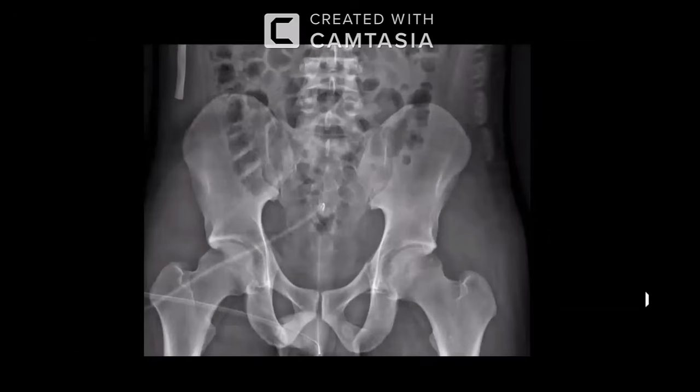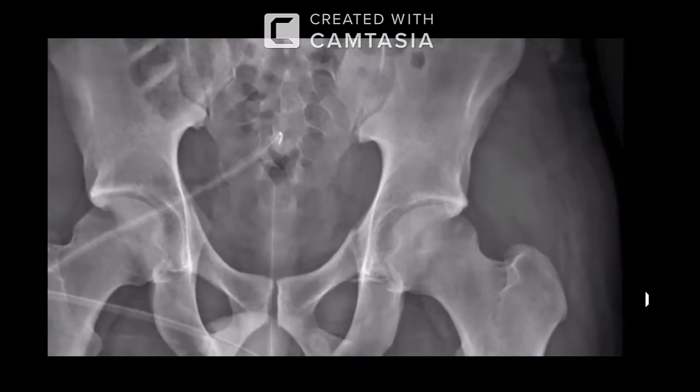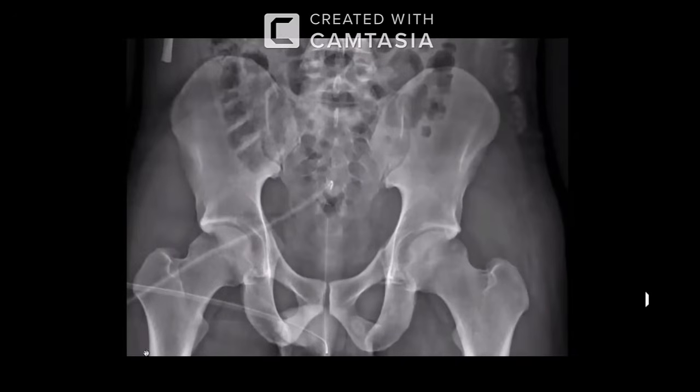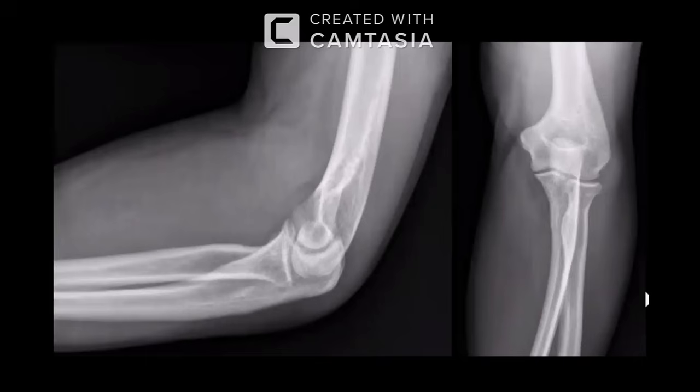You mentioned something with the neck region here, so I think that's just because of the projection. But yes, you are right to raise a suspicion. We did a CT, and the CT was not showing any fractures in the neck region. Okay. So this is the next case for you.